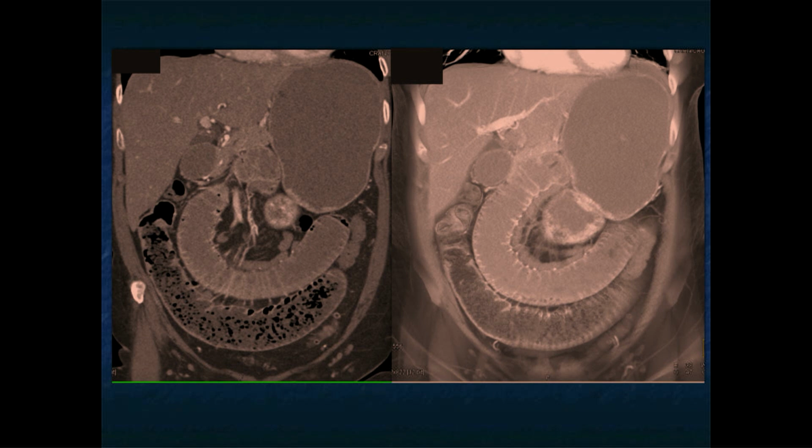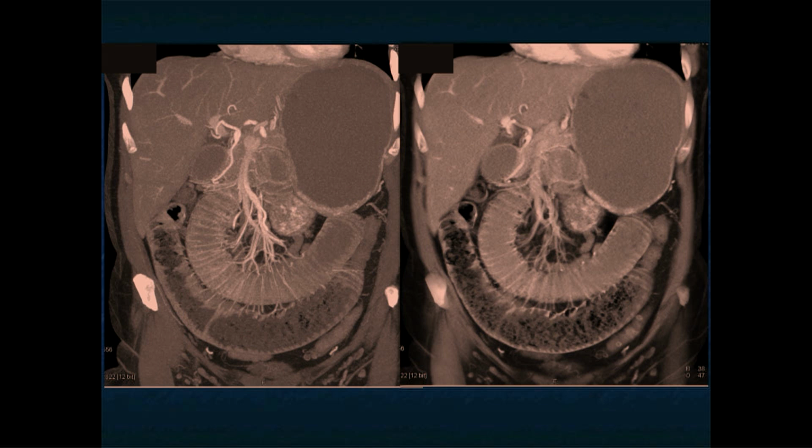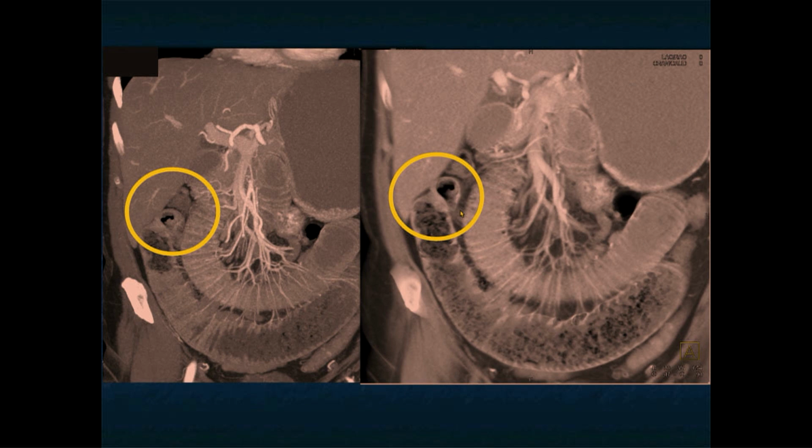You can have feces sign in bowel, like patients with scleroderma or patients with motility states, but then all the bowel is involved. When you start seeing segments of small bowel involved and you go from a dilated loop to this feces sign, you follow the transition to right here, and you know precisely that's the site of obstruction. And in this case, there's no mass present, there's no internal hernia, but that was a band. It was a patient who had an appendectomy 25 years earlier, and that was the band causing obstruction.